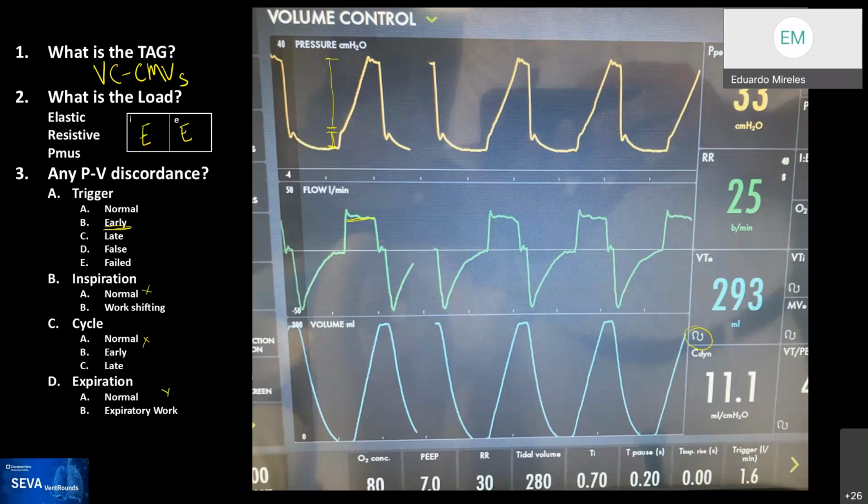So the question is, if we turned off the flow adaptation, would the flow have become perfectly square? No, flow adaptation is that little button, that's the name of the function, that you have seen inside the button that looks like this, with this little tiki tiki tiki.